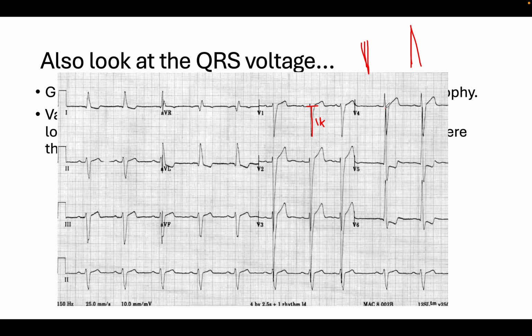So we can see that's roughly there, but we could even measure that one there. But essentially, if we look at this one, for example, because we can actually see the ending of it, let's draw the isoelectric baseline there. We can measure this as roughly 4, so that's 5, 10, 15, 20, add on the 4, so that's 24, actually there's a bit more there, so that's about 26 or 27 millimeters there.